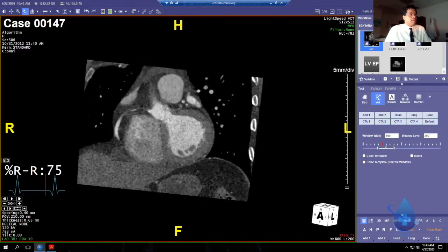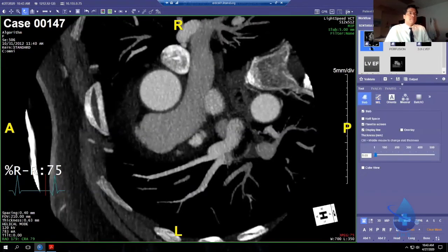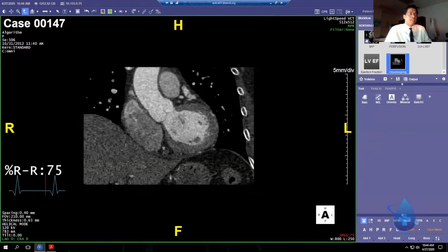The other important buttons you're going to need. Over here are window width and level settings, presets. And down here are also the same presets, more presets for window width and level settings. We'll get to what those are in a second. But those are adjusted by clicking this MIP button automatically. It will change your presets to 700, 350. So this week during the course, you probably won't have to worry about that if you use these macro buttons I'm going to get to here in a second.